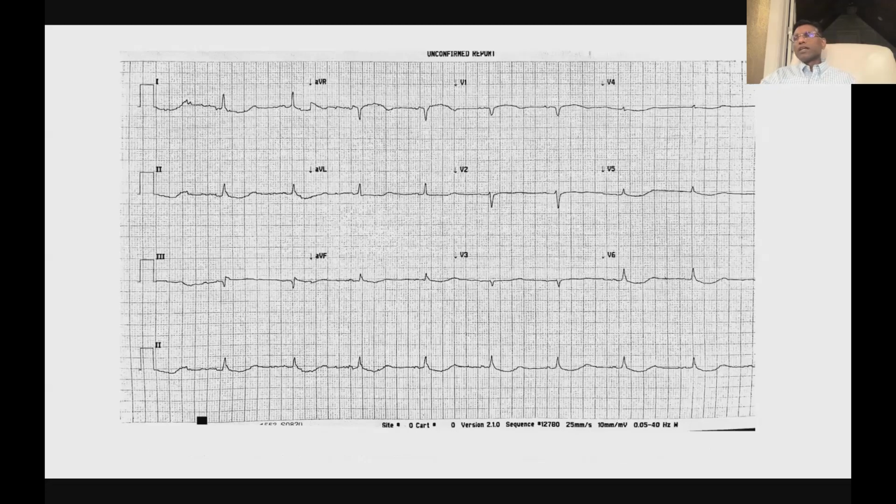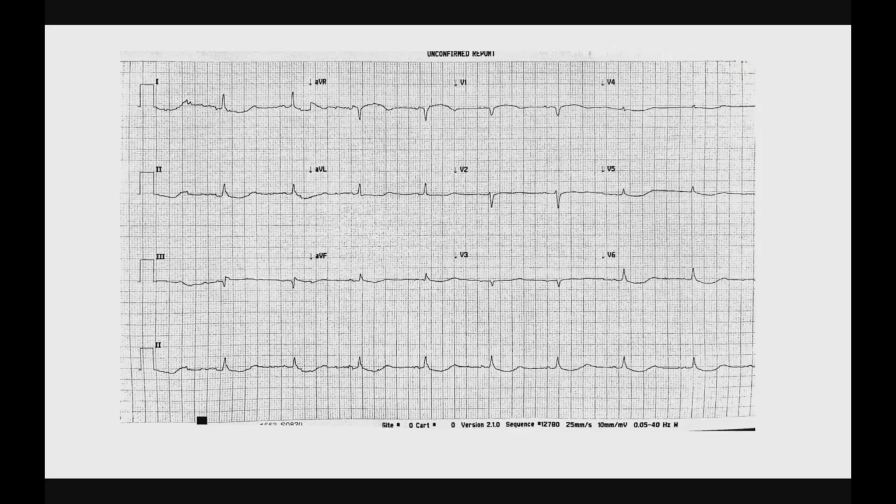I thought I'd do at least one tracing each time I met with you all of something that someone just gave me that week and said, hey, what is this? I get that all the time because I work with a group of cardiologists. So I have other cardiologists or people working with me just hand me an EKG and say, hey, what's going on over here? So I'm going to do the same thing to you. Every time they ask me something, I'll bring it up and show it to you.